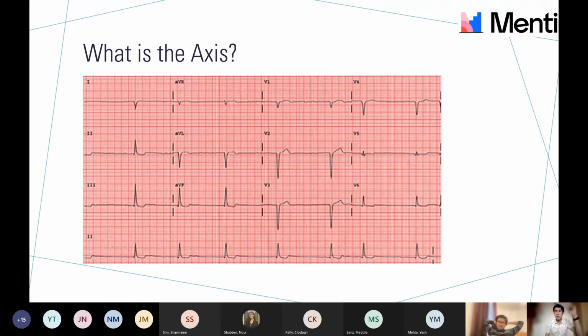And sometimes the leads aren't always positioned in the way that makes leaving and reaching easy. The lead 2 might be next to it rather than below it. But choose what works for you. Okay, so if you want the sort of easy mnemonic, that's in the notes of this slide. Okay, 5 seconds until voting closes.